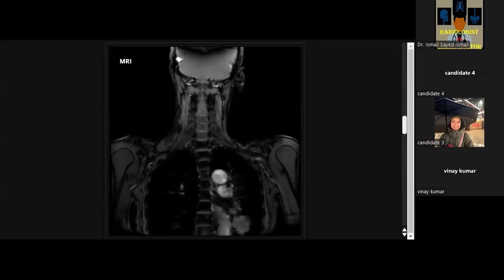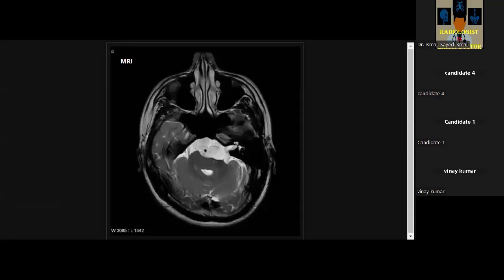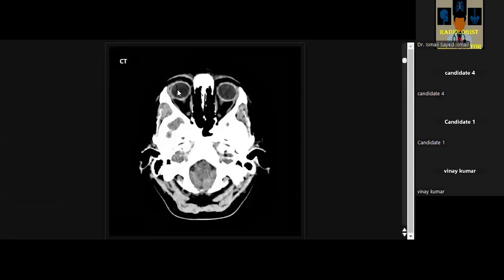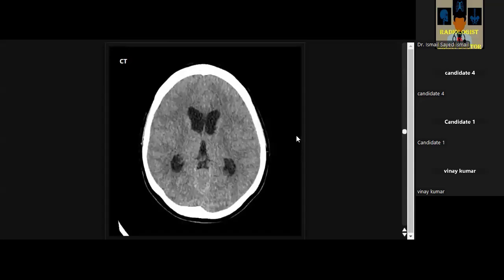Okay, candidate one again. Are you with me? Yes. Okay, easy case inshallah. Posterior fossa. Ask for control. Okay, proceed. All right.